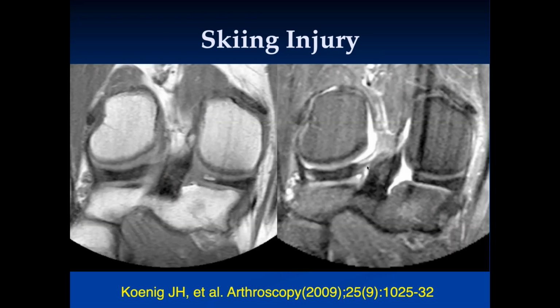If we could go back, is that a bony signal? And so it looks like there's an avulsion as well. So this is a root avulsion. You can see the bone has been avulsed off along the root there.